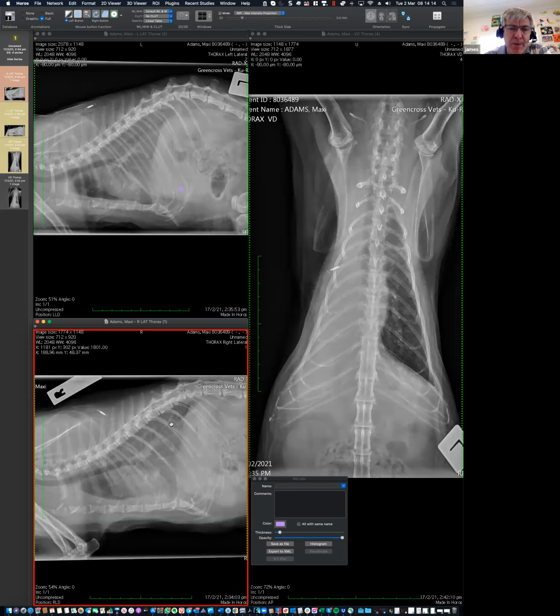Could you try and get some pleural fluid? Okay, good point. So how the boundary of the lungs on the cranial aspect looks a bit rounded, and it's lifted. There's space between the sternum and the lung, so you may have a chance of doing that. Okay, good point. And I love that you mentioned that, because my next question is probably the obvious one, and I think you are already answering my question, but we need to put it out.